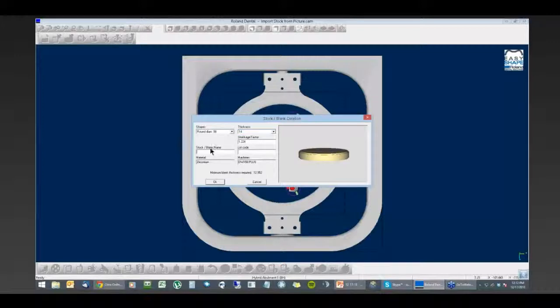We've got a new option here as well. It's called lot code. We'll go over that here in just a second. But I'm just going to give my disk a name. We're going to call this test. And then the lot code, this can be something for FDA traceability.